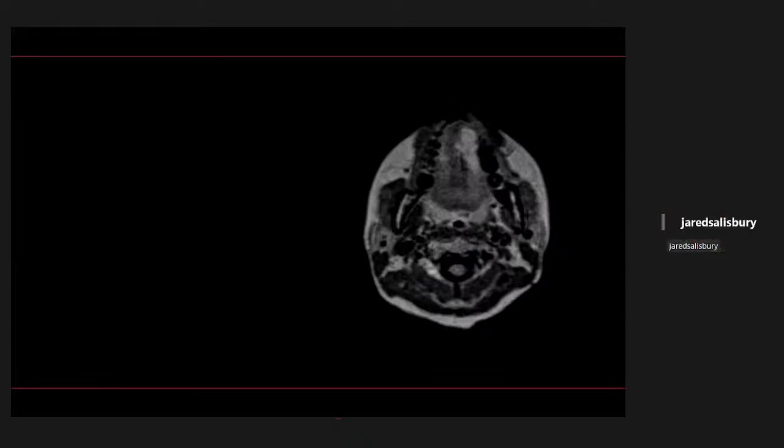All right. So in the FLAIR image, we're getting more at the level of the floor of the mouth, I imagine. I expect with seizures it would be more brain parenchyma. Seizures, brain, don't often come from the mouth, do they? But I'm noticing some increased signal on the left floor of the mouth. I think that's, I don't know, the lingual space. But the brainstem itself looks okay to me. And I'll tell you, we're actually cutting through the level of the tongue.